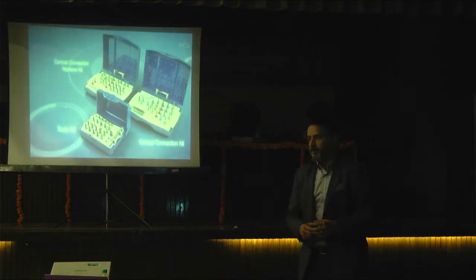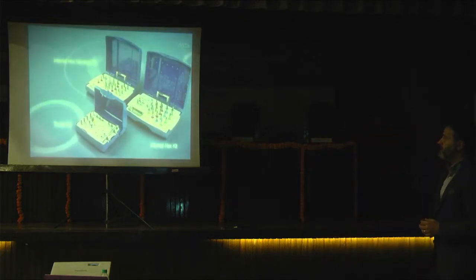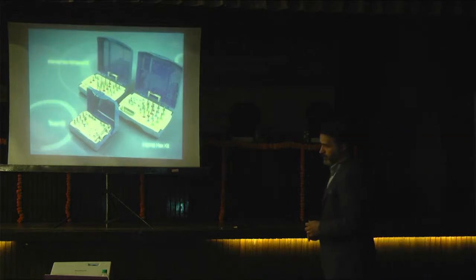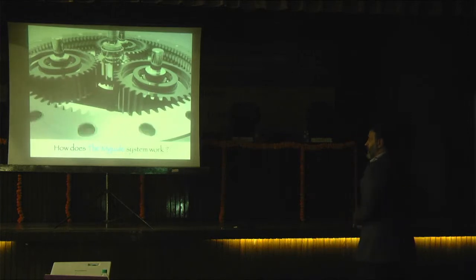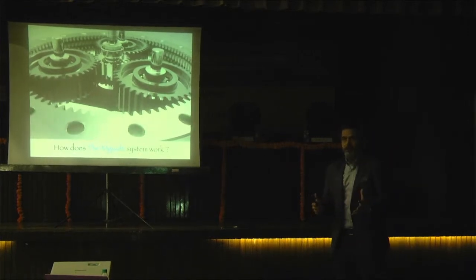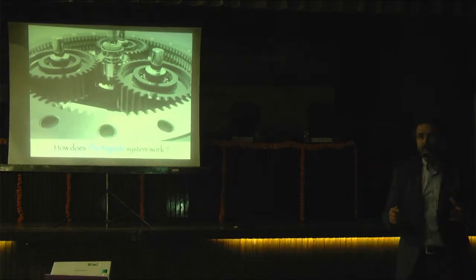These are the kits. These are the sets for guided implant surgery. So, how does the M-Guide system work? How do we create the data? How do we match the data? How do we do that?